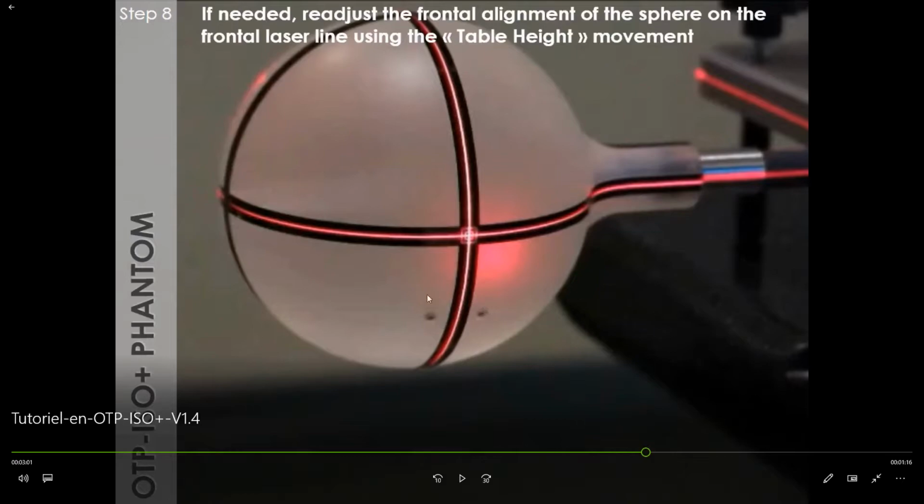Here, on the periphery, you see a pair of tungsten balls. In fact, there are 3 pairs of balls, one at the top, one at 120 degrees on this side, and one at 120 degrees on the other side. When the gantry rotates, the distance between the central ball and the pairs of peripheral balls will evolve according to the gantry rotation angle. By determining the distance between the central ball and the pair of balls, the gantry rotation angle can be determined. That is, the radiation or treatment angle.